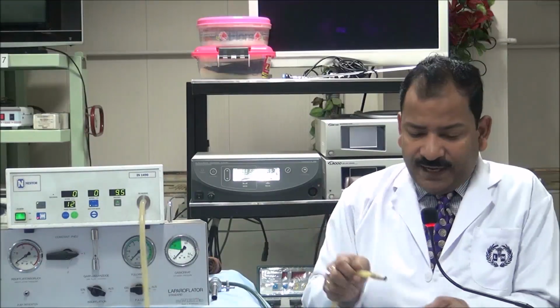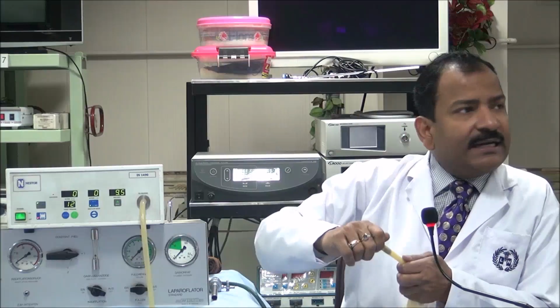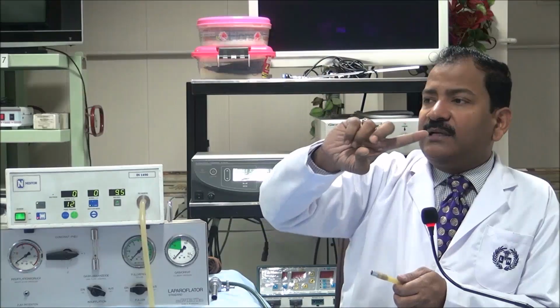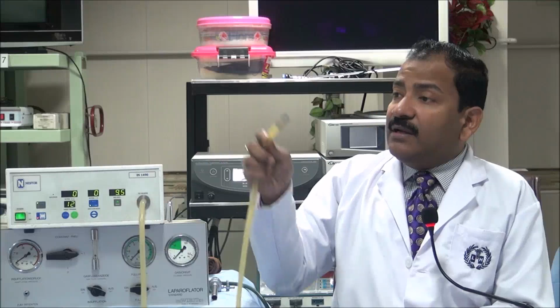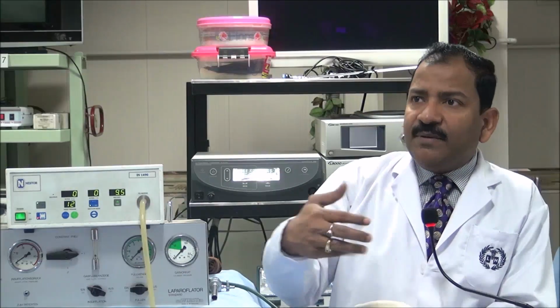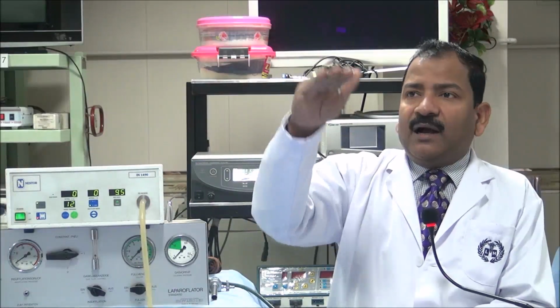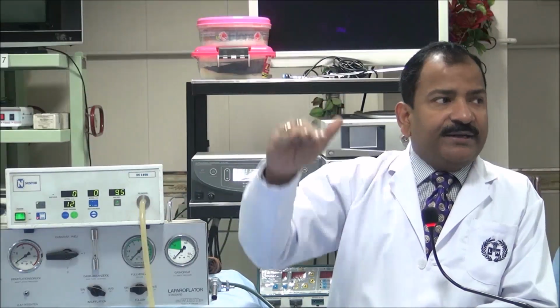Calibration, there are two ways. One way is if you have a dial type of BP instrument, then you directly attach the tubing, and the dial type of BP instrument will show you exactly how much the pressure is. Another way is if you have a mercury column BP instrument, then you put it like that and tie a knot here. After that, you wrap the BP cuff around this. Then start the gas and bring it up to the zero level of the column. Here also zero, and the BP mercury is also zero.